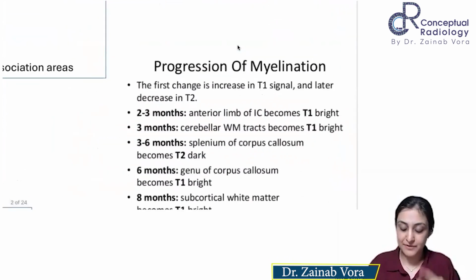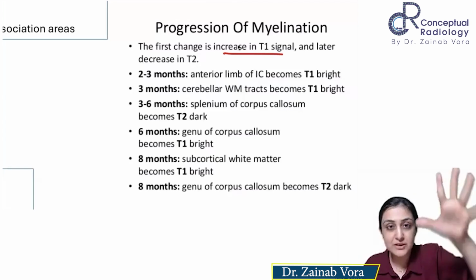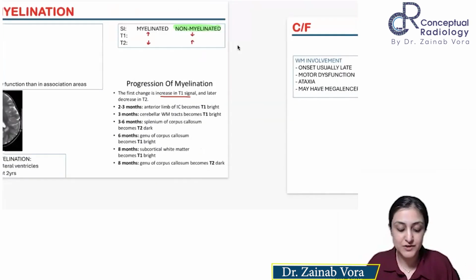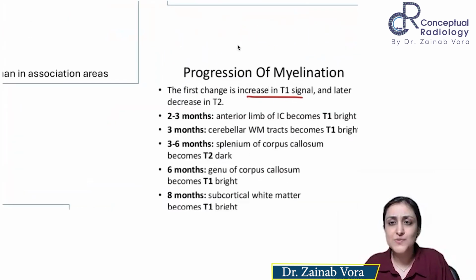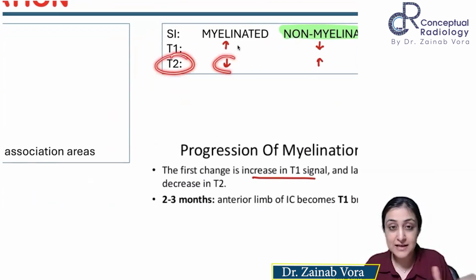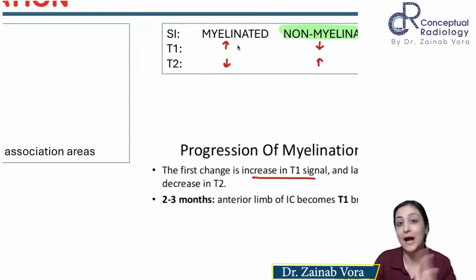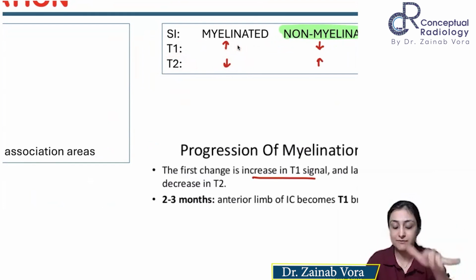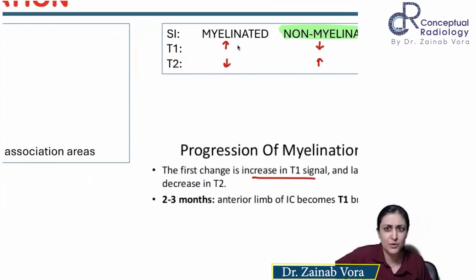So how is this happening? It's not both going together. First, what is manifest in the normal progression that we were seeing in a normal baby, the myelination, but water is white. Yes, water is T2 hyperintense. So decrease in water will be T2 hyperintense decreasing, which is T2 hypointensity. Is that making sense? Is that very complicated?